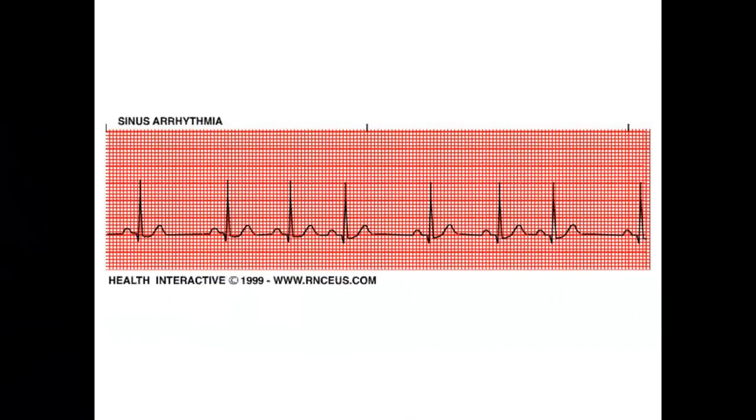To be absolutely sure, I just want to give a quick visual illustration of what heart rate variability is. So as you can see, we've got a typical ECG waveform here, and on the left, or let's say close to the middle, you have a relatively large RR interval, highlighted by the green arrow. Two heartbeats over to the right, you've got one that's relatively small, and you see that pattern pretty much throughout the entire ECG. That's what we're looking at, is how does it change beat to beat? How much is it changing beat to beat? And when does it stop changing?